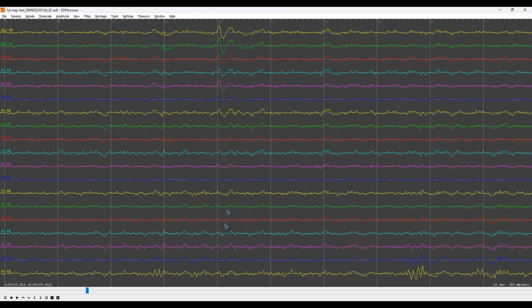It's just showing up through all 6 of the frontal training sites, FP1, FP2, F7, F8, and F3, F4. We just see it going all the way through, and it's actually even affecting FZ here. And by the time that eye blink got to CZ, it's really dissipated. We really don't see much at C3, C4, the temporals. There's these little tiny bumps, but not like what we see up here.